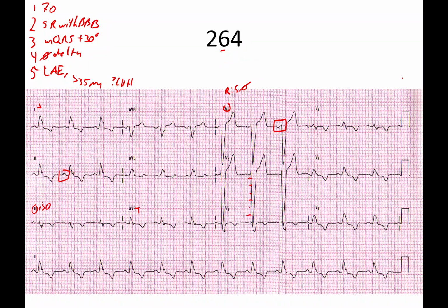And so we'll change our colors real quick to green, and we'll do 6. Wide QRS. And of course the answer is yes to that question. And we'll do just like we have been. So we'll hunt in lead 1, V6, and V1. And here we have our kind of broad QRSs. It is notched, but you'll notice that in this case it is R, lowercase r prime.